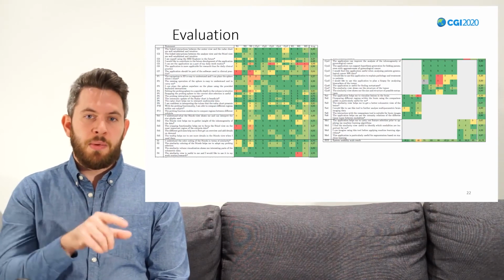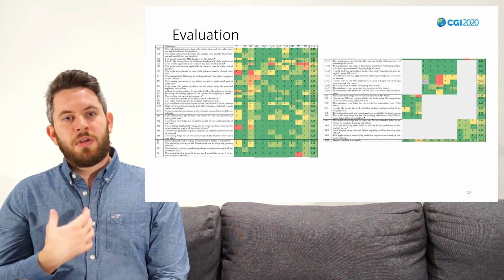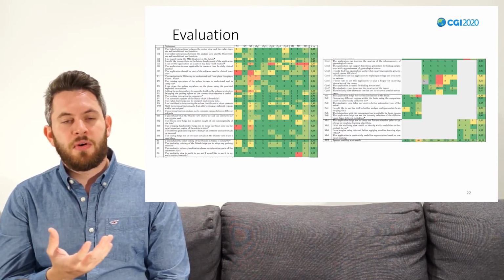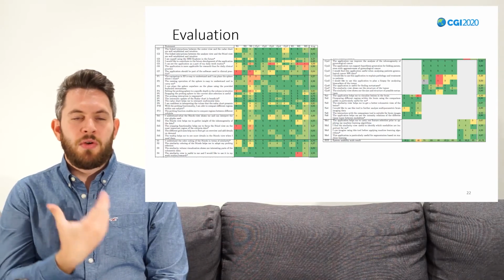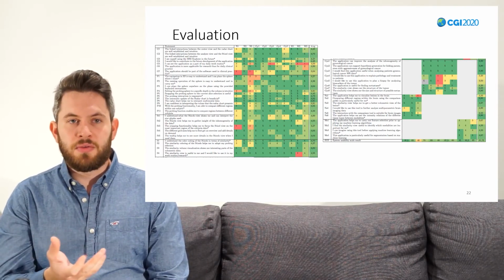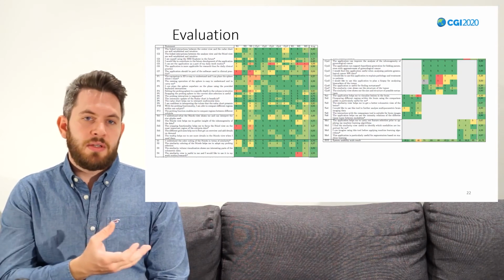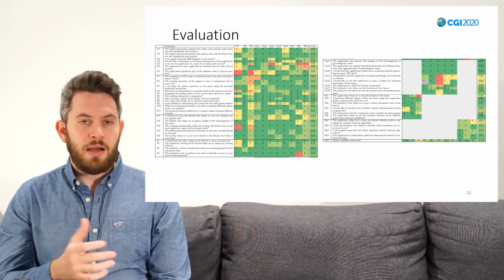So what are these red spots? Now here I would like to give you a short notice on them. So we developed this application for research purposes, but we wanted to know from the experts also how useful they would find it in a clinical routine. And there we could see that some say, yeah, that could be useful, and some said, I'm not so sure.